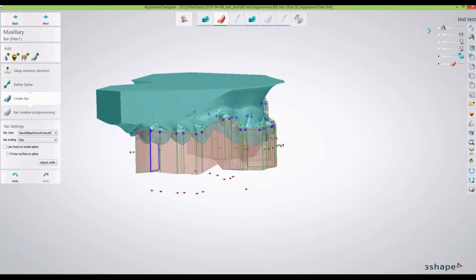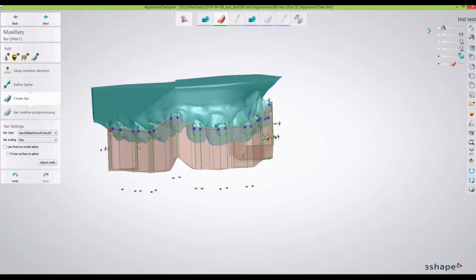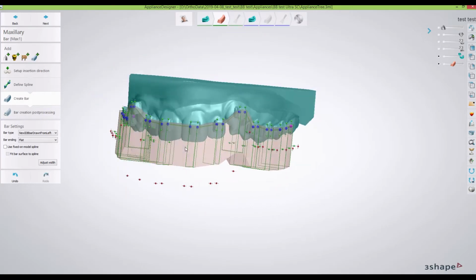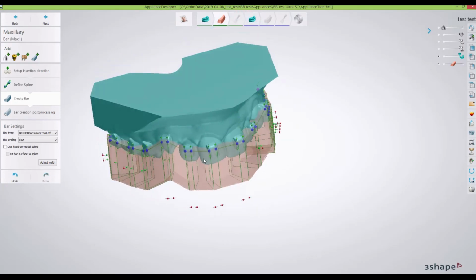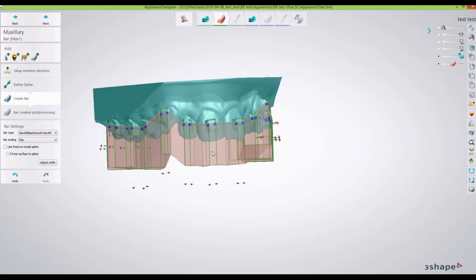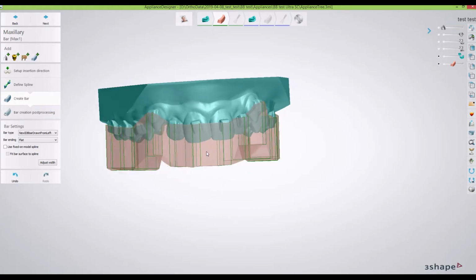So we may want to take these molars up just a little bit, and then I want to watch wherever there's big differences between the heights to see where that ends up. But we actually look pretty good there, and the same there. So often you may need to adjust that. The other thing you're going to have to look for when there's a bit of a significance in the malocclusion, or things are really rotated, or there's a lot of crowding, you may find that when you look at this, you'll see a bracket sticking outside the tray, meaning the tray is too thin.